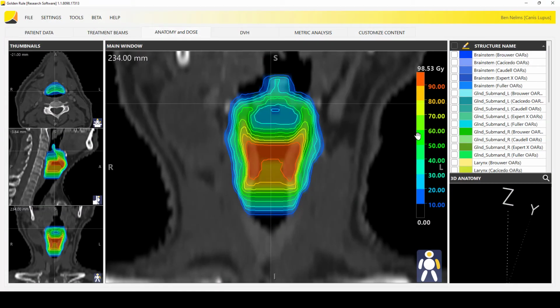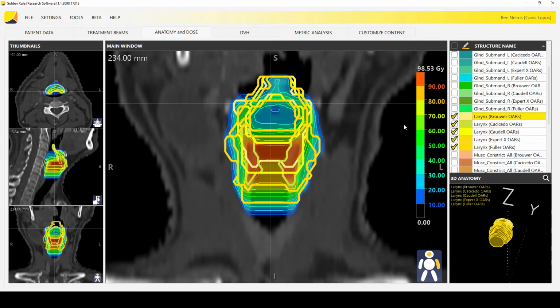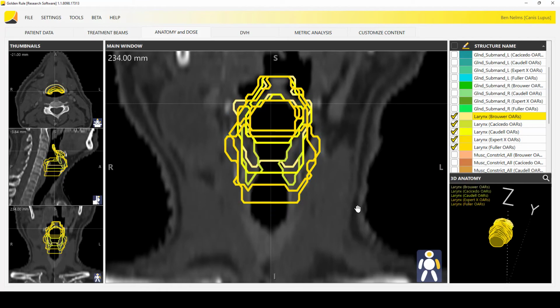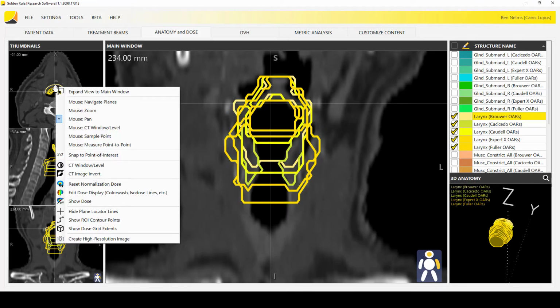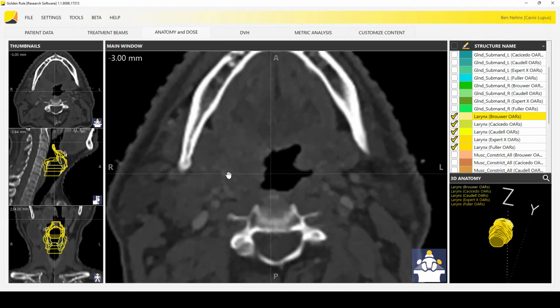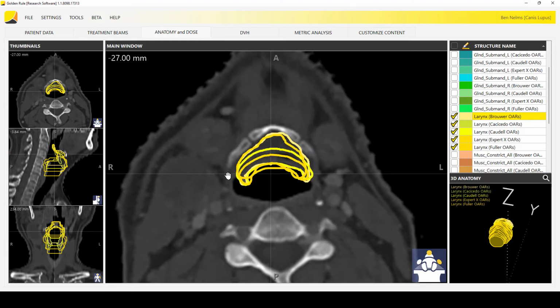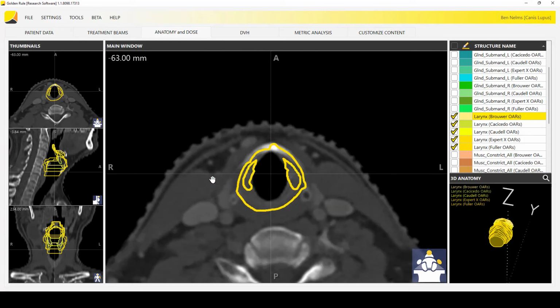Let's see how our experts looked here. I'm kind of curious to see if they're as different as the population is. Yeah, pretty different. If we go slice by slice, I'll start at the bottom. I'm sorry, let me get to the bottom here. Don't want to fly through.